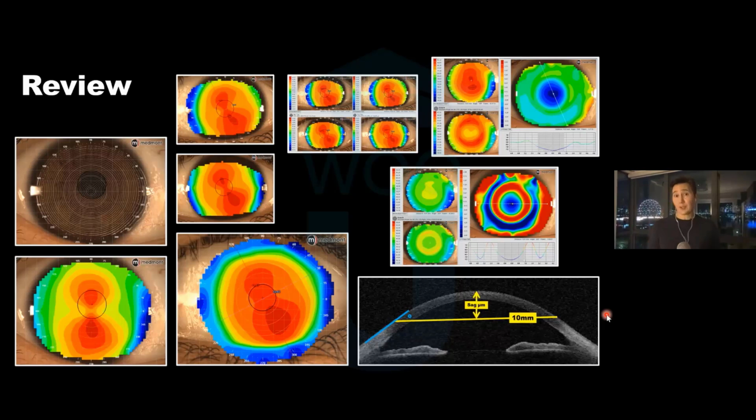Take a geometric centered topography for your Ortho-K lenses in wave. Take multiple readings. So take minimum of 4 maps. Look for reproducibility. Throw out the bad maps, keep the good ones, choose the best one, send that one into wave. Figure out how to use that subtractive map for your post-orthokeratology analysis.